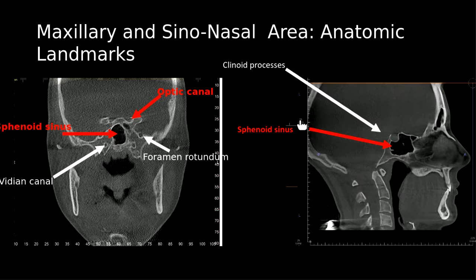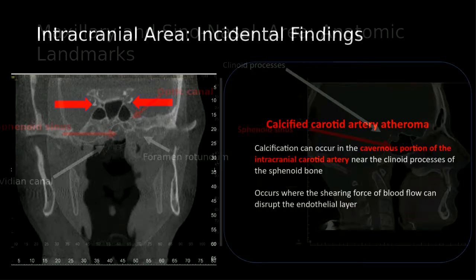And here also the sphenoidal sinus. I put one image there and ask them which one is the sphenoidal sinus, or what area is this one. So please make sure you know the sphenoidal sinus.